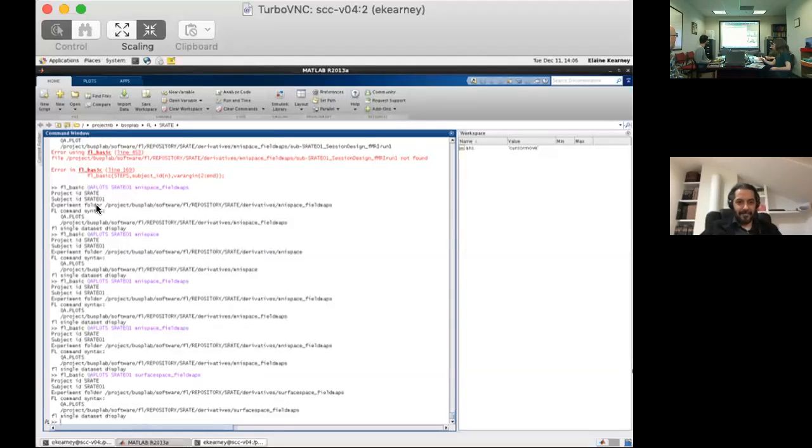All right. Okay. So Elaine is going to share her screen. Excellent. So start with that. We're going to look at some of her recent field map-based processing output. Can you see it, Alfonso? Yes, perfect. Thanks.